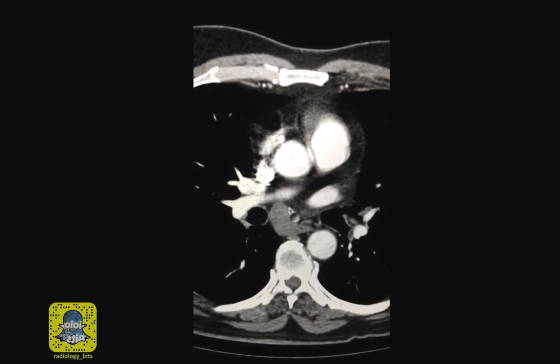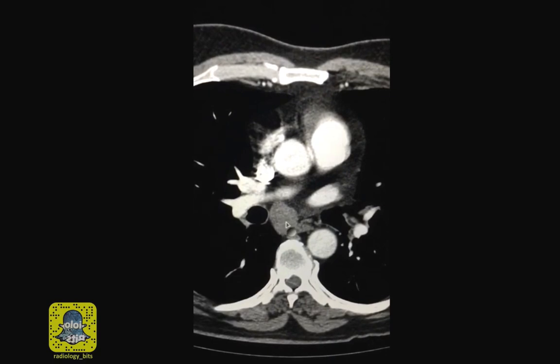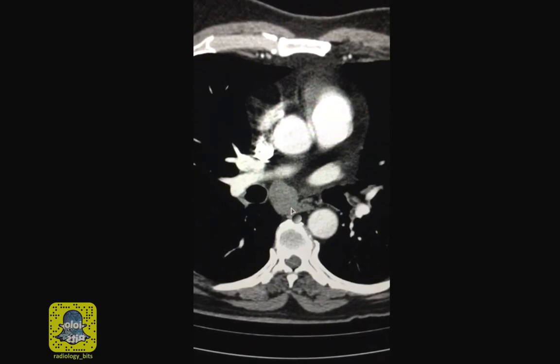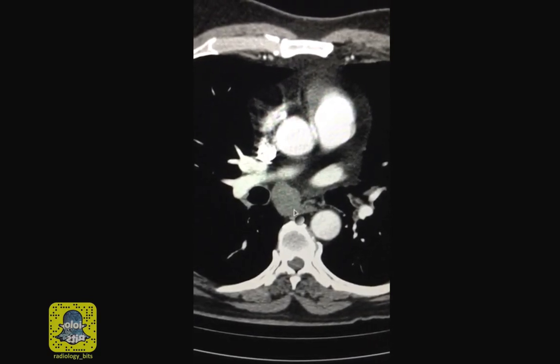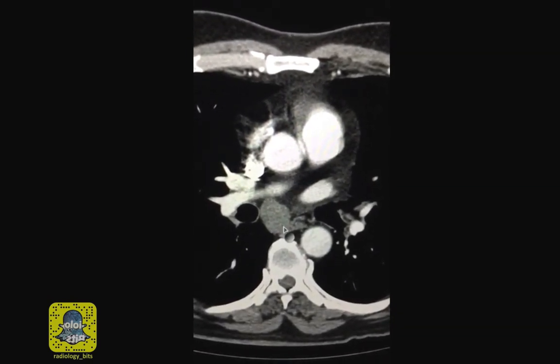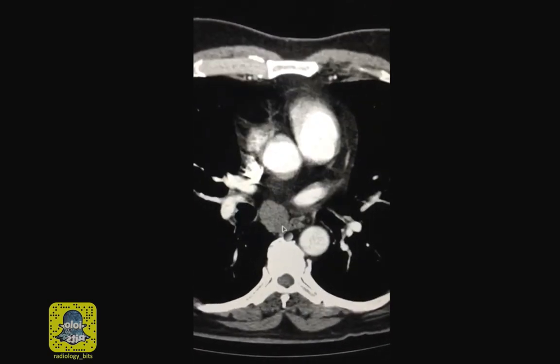The wall of a bronchogenic cyst may calcify in a curvilinear appearance. The cyst may contain calcium that goes down to the dependent regions. Such calcium might give you a fluid calcium level, what we call a milk of calcium appearance. It's very important to emphasize that foregut duplication cysts, such as this bronchogenic cyst, should have no enhancing components. An enhancing component would mean a soft tissue composition, and that would change your differential diagnosis.